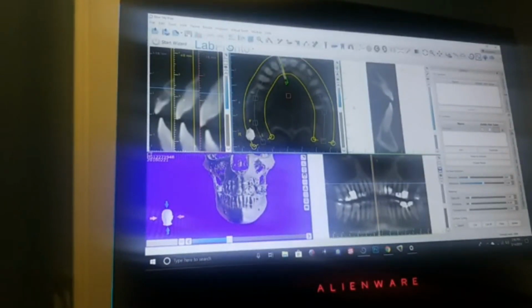The other thing I do is try to maximize my tangential view of bone. I grab onto this yellow line. I'm in the axial right now, guys. I take one of these yellow lines on each end, but you have to be in panoramic mode. This is right now in the panoramic mode. Remember, all the images between the two yellow lines are together and it shows your panoramic view.